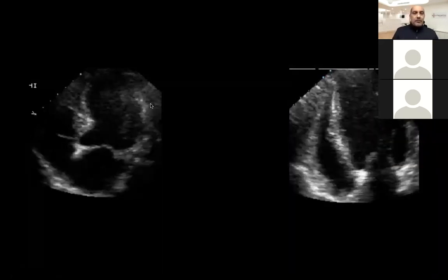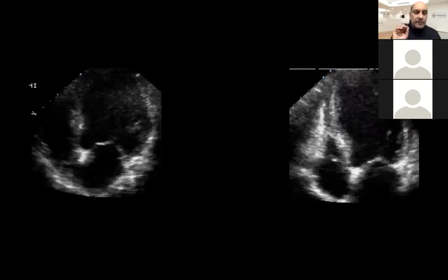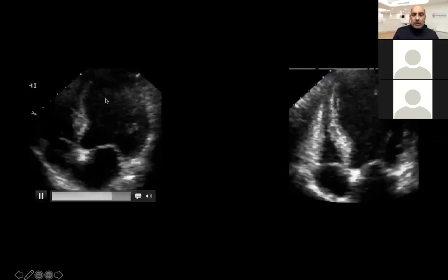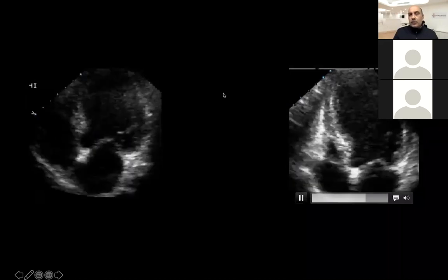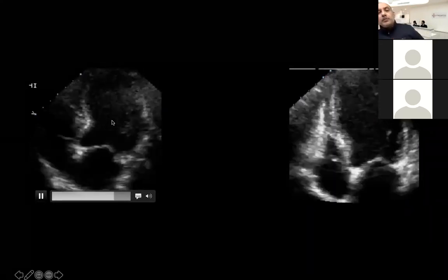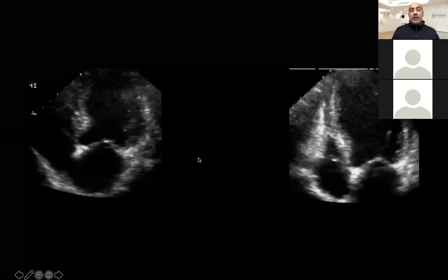Can you imagine that both these echocardiograms are of the same patient, and they were taken just a few beats, a few seconds apart. This is a foreshortened four-chamber view where you can grossly miss the apex contractility, and the apex is not visualized here. And that is why you can change the ejection fraction from 20 straight away to 45% without doing any intervention. And that is something which we have to keep away.